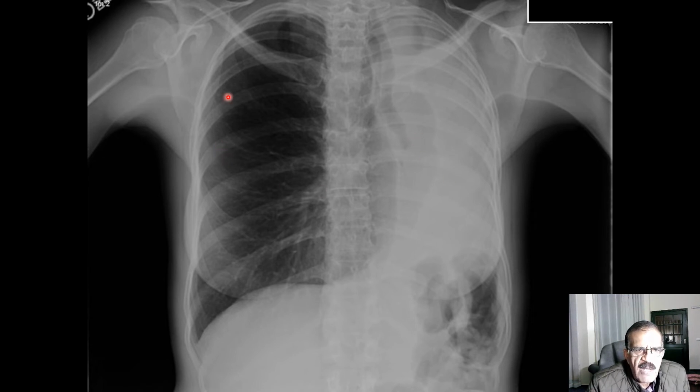And you can see the right lung is also actually prolapsing into the left hemithorax. This black column is air, and this is actually part of the right lung, which is prolapsing into the left hemithorax. So this is very obvious. There are two conditions which can lead to loss of volume. One is collapse, the other is fibrosis. Fibrosis has a different pattern. Fibrosis would have a more non-uniform reticular nodular pattern. This one looks like collapse.